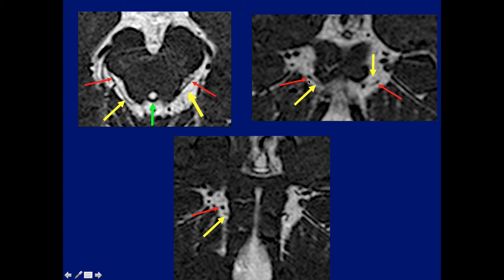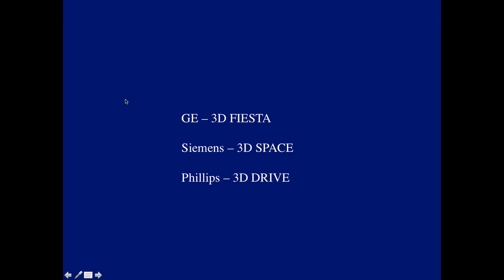Here's a nerve. The problem is there are always branches of the superior cerebellar artery, so you have to be careful not to mistake it. And again, here on the coronal plane, here's the nerve and one of the branches of the superior cerebellar artery. So that's the key, to identify the superior medullary velum, and then on thin T2s you can identify it. Not as good as the Europeans, but getting close. And again, we have to use one of those 3D sequences to be able to see the fourth nerve.